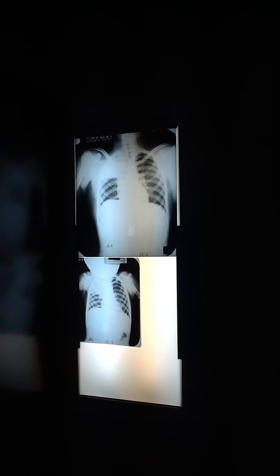lung change? Did the actual physical volume, the amount of space that the lung is taking up there, did that change? No. And how do we know? Because the fissure didn't go anywhere. Now, the fissure could only go one of two places. It can either go this way or it can go this way. It can go up or down.